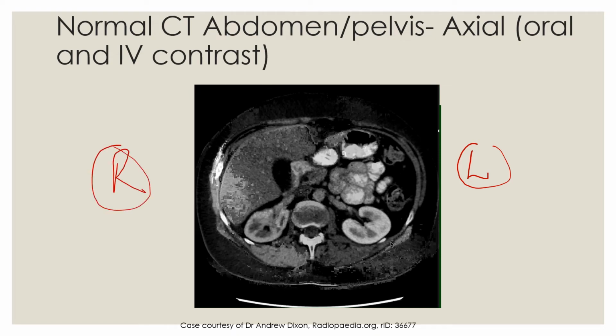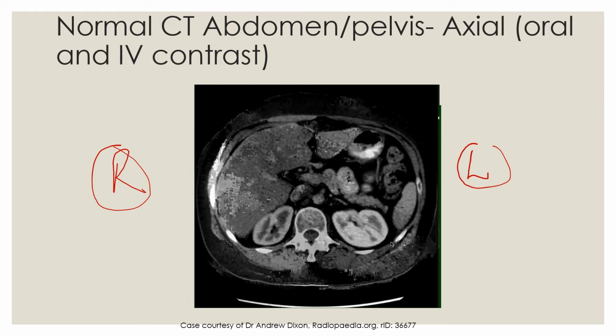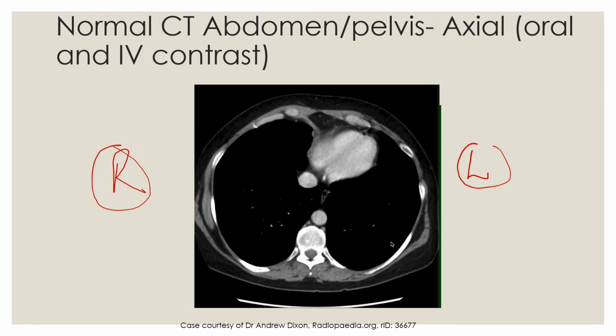The first thing that we notice on our screen is the lungs. Right at the top, our lungs are low in density as a result of being filled with air. Other things that we notice are high density bones, as well as our ribs. And our ribs are not all in one plane, as they do not form a completely perfect horizontal line.